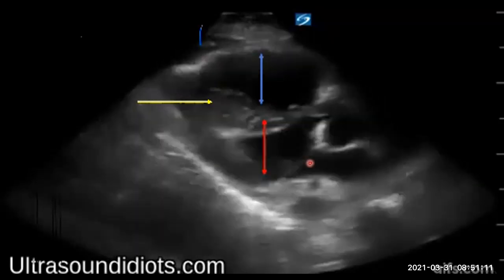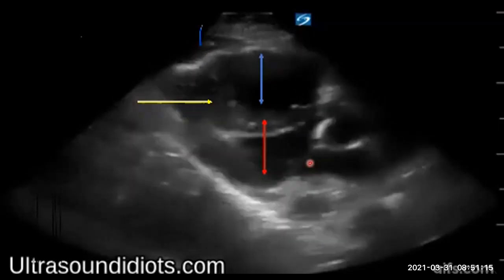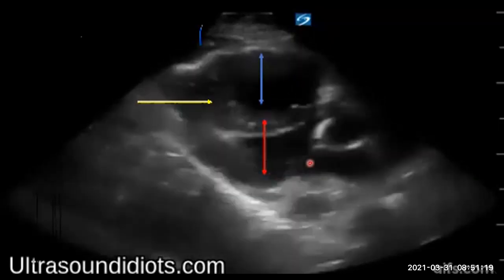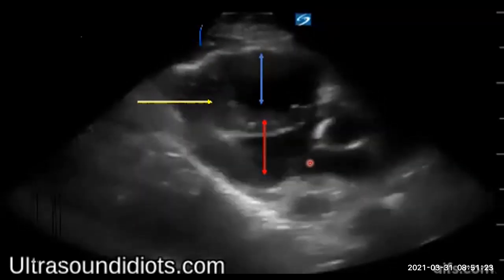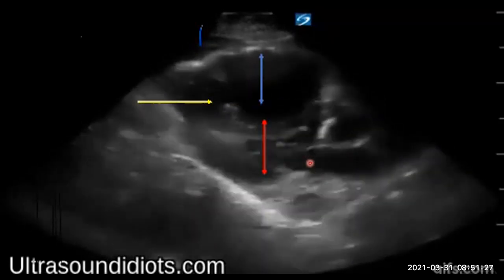Now, on Monday, what we realized was that there are a lot of signs of pulmonary embolism on ECG. But the most common one is to have inversions of the T wave simultaneously in the inferior leads, 2, 3, AVF, and in the anteroseptal leads. That means V1 to V4. So you have all these T wave inversions.